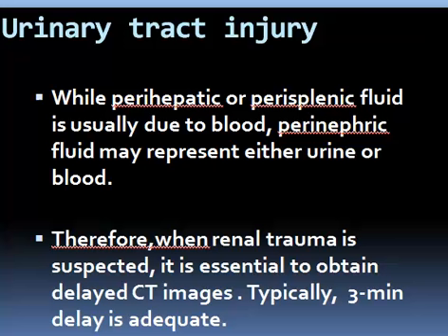You know that perihepatic and perisplenic fluid in trauma is usually due to blood, but perinephric fluid may represent either urine or blood. Therefore, when renal trauma is suspected, it is essential to obtain delayed CT images after contrast. Typically, a 3 minutes delay is adequate.